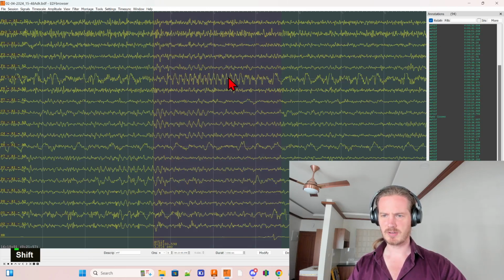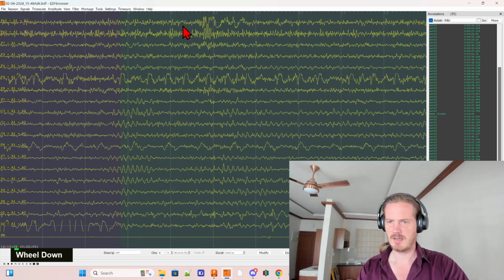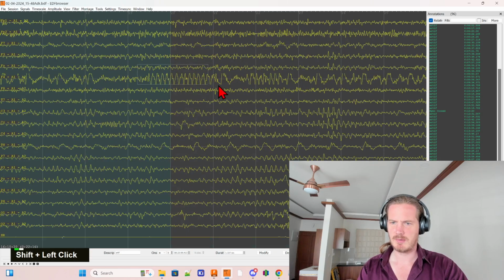This is definitely something going on. It has nothing to do with what we're trying to record. And I'm going to remove this part due to O2 being all messed up. And I'm going to remove this part. And then we have reached the end of the eyes closed period.